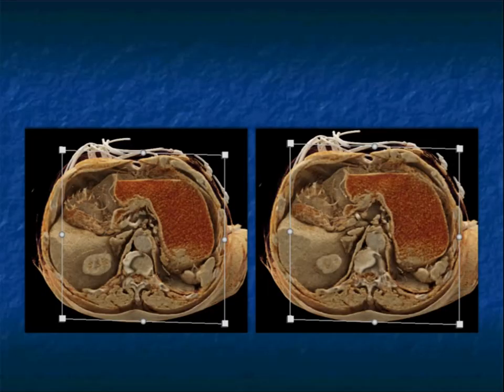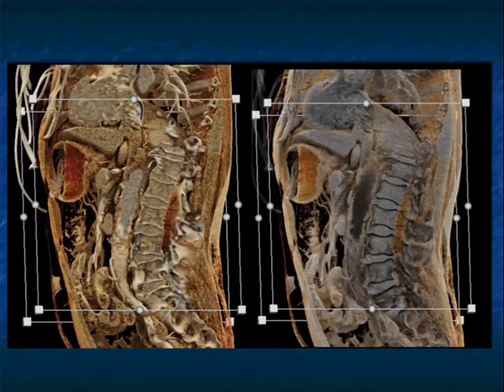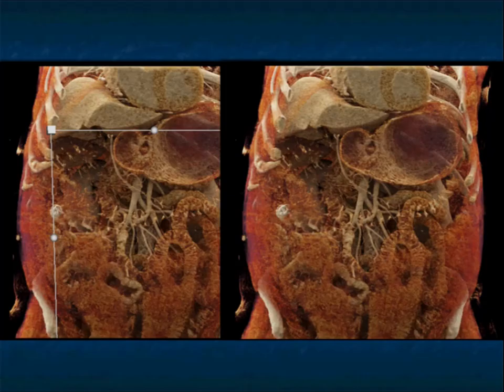Here it is very nicely shown on the cinematic. There was fluid in the stomach, water was given. But you see the posterior wall is thickened. There's the ulceration, and there's the perforation. And again, here's the cinematic with the sagittal view, very much like the other sagittal view I showed you. Interestingly, one of the things you can do with cinematic is really show very nicely the texture of the folds. And here, this is really the first time we're ever able to see this. That's actually the ulceration, and that's the perforation.